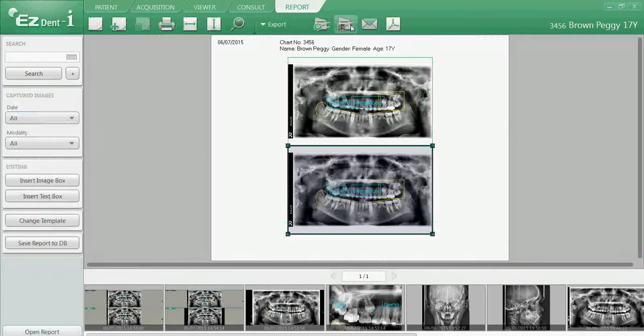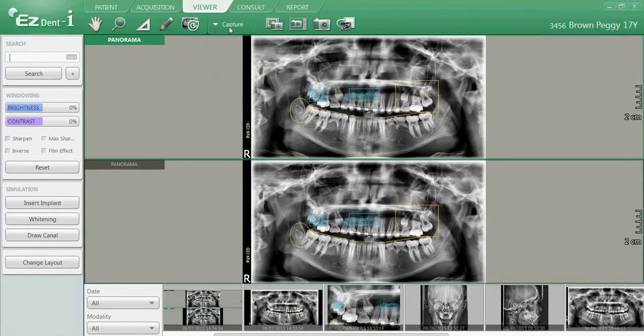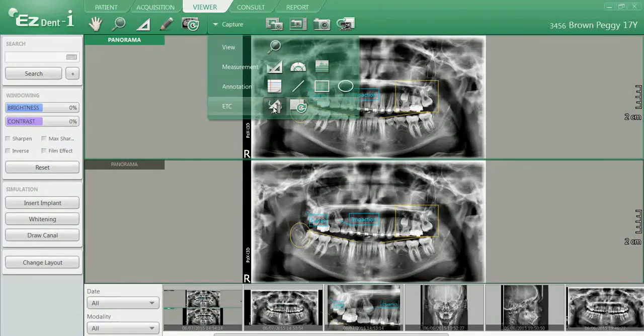At the end of the row of image captures, I have the ability to send all this to a report. When I left click, this will bring me to the report module. These functions will be covered in a later video tutorial.